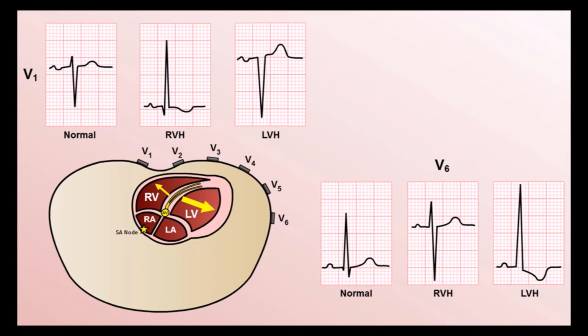One can summarize these findings by saying that in the precordial leads, RVH causes the QRS complex directionality to be the inverse of normal, while LVH causes the QRS amplitude to be more pronounced but in a normal direction. As leads 1 and AVL run in the same general direction as V6, often the same findings we see in V6 here in both RVH and LVH will be present in those limb leads as well.